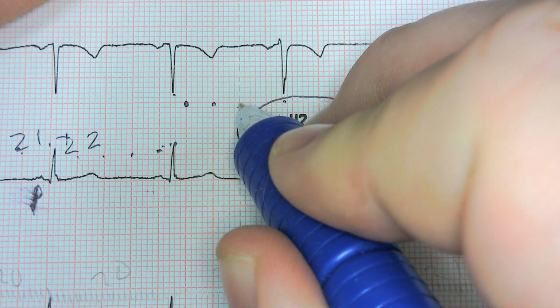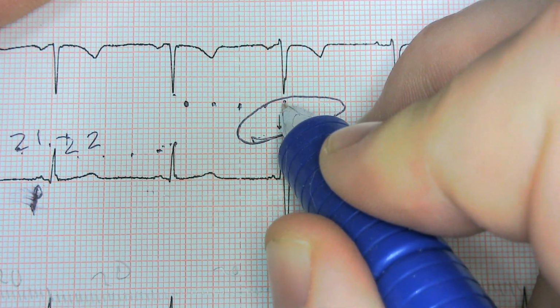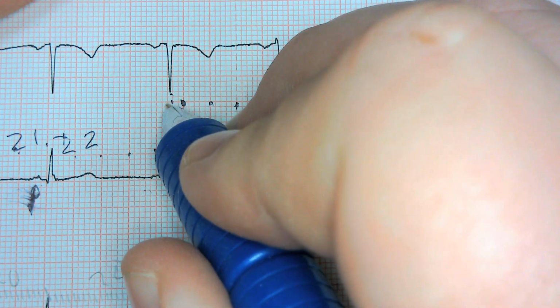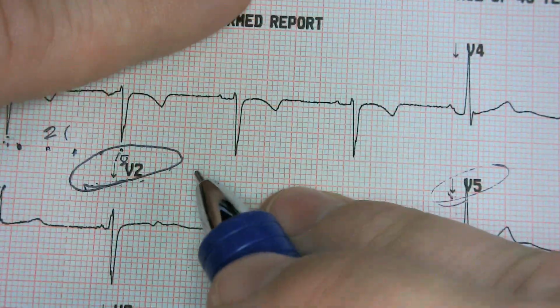5, 10, 15. We're too shy right there. So we're at 18. And then we got to go over here where we haven't counted. 19, 20. Right? You could say 21 because this is looking closer to here than that. So anyways, 20, 21. Either way, we're still within that 3.